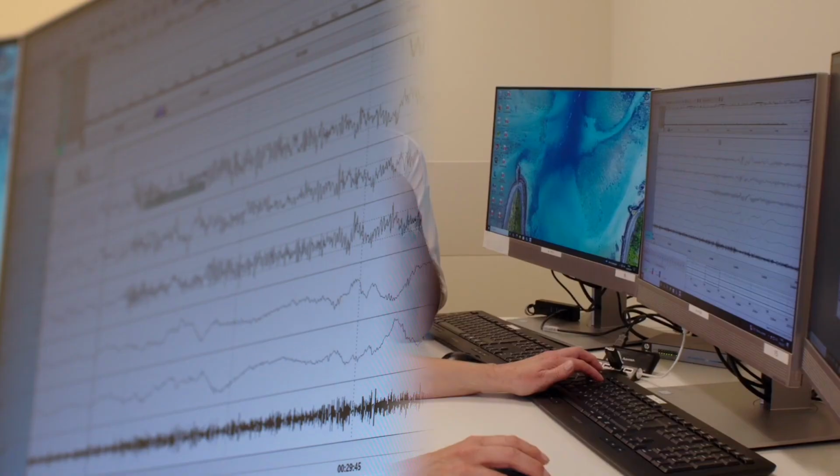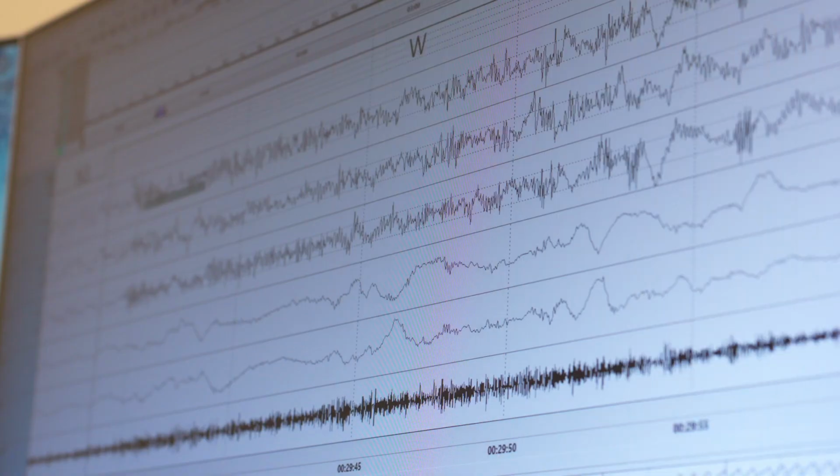You never know what the next page will bring. Instead, he looks around again. But if we go back one page now, we can already see the first theta waves. Can you go back briefly to that one spot where the patient briefly woke up while falling asleep? Mm-hmm. That's the point. Patients often describe twitching with their legs.